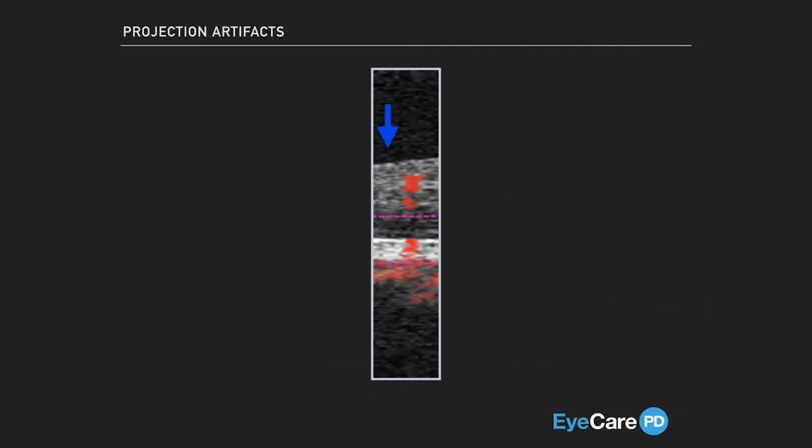Shown another way, here is an example of a tiny section of an OCT-B scan with flow overlay denoted by the red aspects, or more specifically, red means the machine detects flow within the structural scan. Look at the blue arrow, noting light from a tiny sliver of this section of the neurosensory retina.